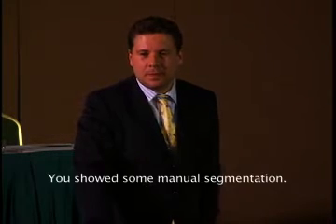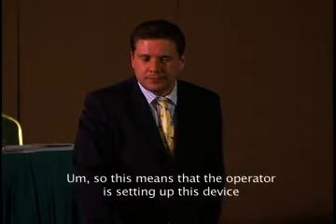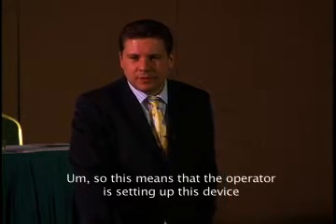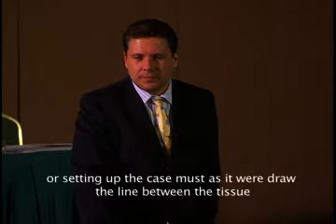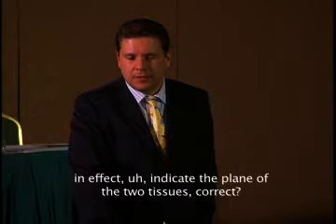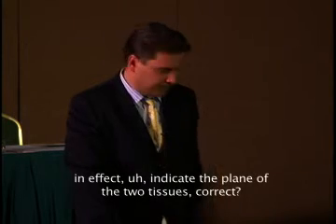You showed some manual segmentation. Right. So this means that the operator in setting up the device, setting up the case, must, as it were, draw the line between the tissues. In effect, indicate the plane of the two tissues, correct? Okay, there's different scenarios.